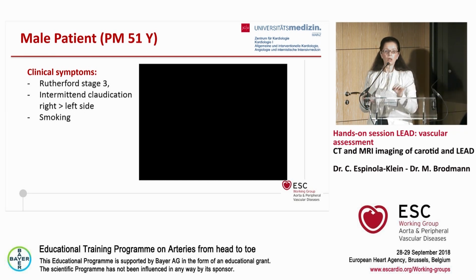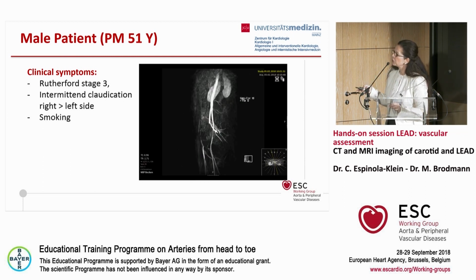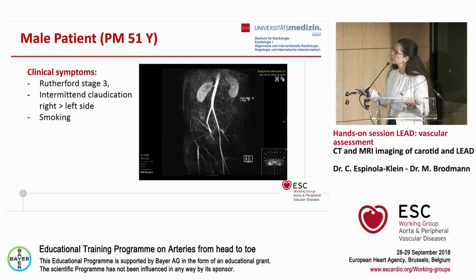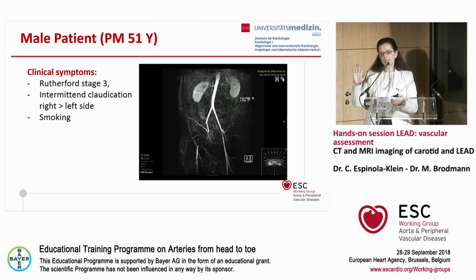Our surgeons say, why do you show us these images? Just do a revascularization. But from my point of view, I see two problems with this. We are very close to the common femoral artery. And if you perform revascularization, for example from the crossover approach or the brachial approach, you have a landing zone with a high probability within the femoral artery.